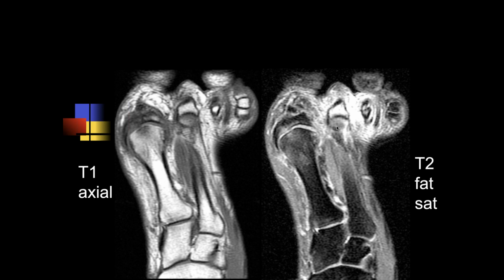Yeah. What happens in the extremities like this is you get variation in the field strength. And the fat suppressed technique is at a given frequency, which assumes that the water nuclei are at a uniform field. If the actual magnetic field at the location of the water molecules is different from what you assume, then you may either suppress it or not suppress it, if it's inside the SAT band or not. And so this is a common problem of field inhomogeneity that we see in the foot and ankle.